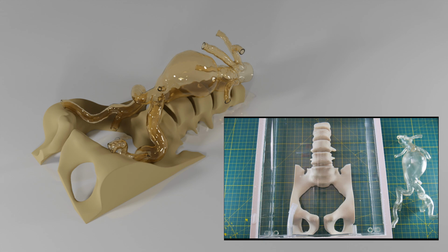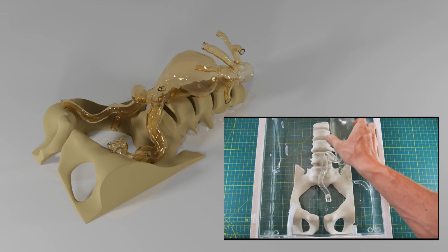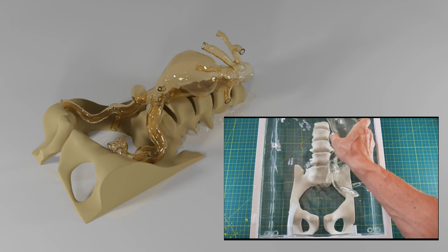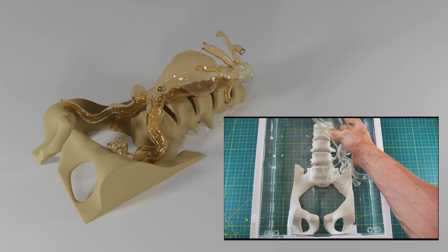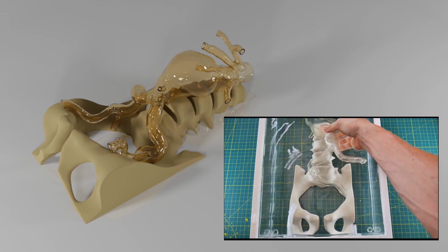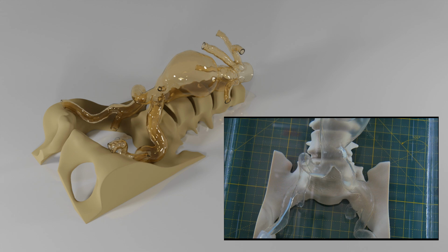Besides the common use as a dry model, it also can be submerged in a container filled with water or connected to a pump. This enables some additional advantages. First, the level of transparency is being highly improved. Second, the fluid works as a lubricant for the guide wire and catheter, especially when using tools with a hydrophilic coating. Finally, when using warm water with a temperature equivalent to the human body, the use of self-expanding stent grafts will be enabled. Due to these benefits, we recommend the wet use of vascular models.